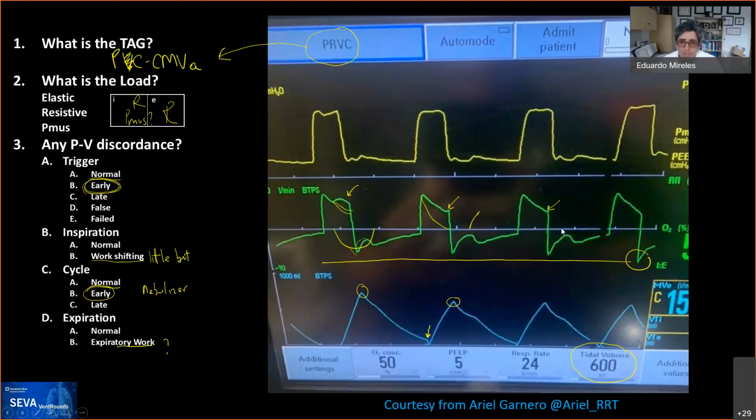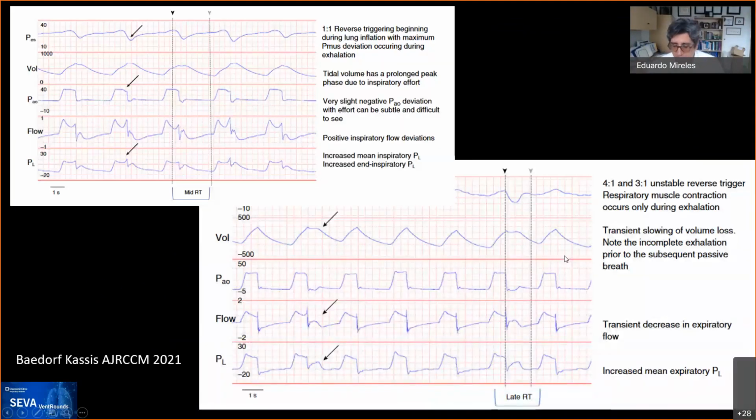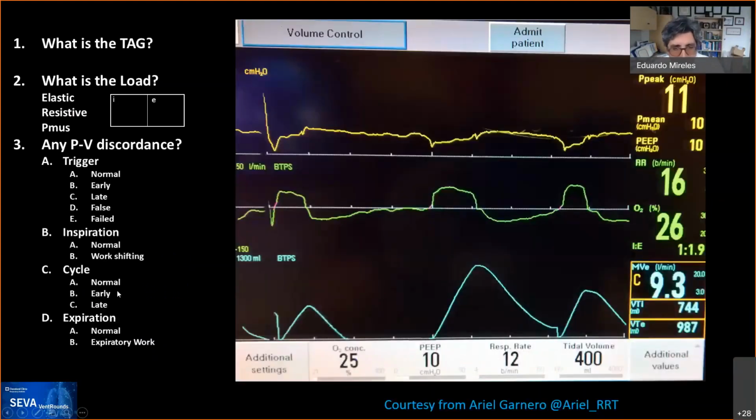All righty. Great question. This was a really cool case. I don't see Angelo in the call yet, so we're going to do another one and then we'll go back to the other one. So this is also from Ariel. He had a good set of questions sent out to us. So let me put the poll up now that you know how this goes.